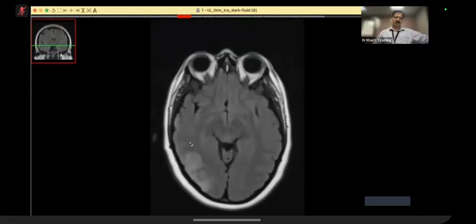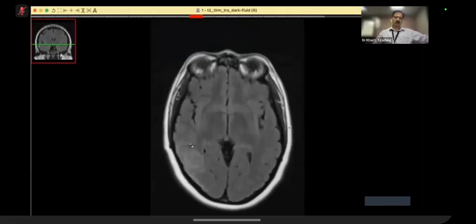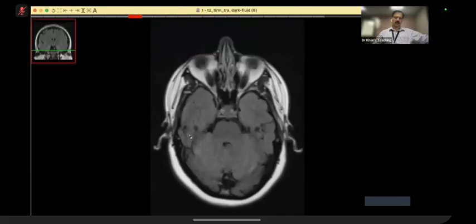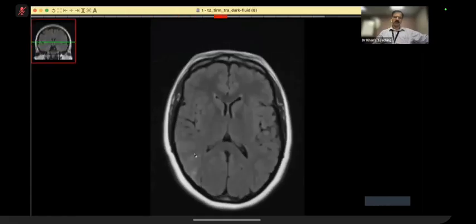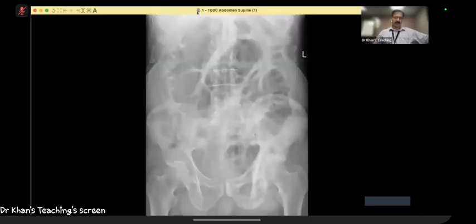And in this case, we did venograms, etc., which I am not showing you right now. The right-sided transverse sinus was hypoplastic. So the hypothesis is that this cortical vein was quite prominent and it was thrombosed, and because of that, there was a venous infarction. So I just wanted to show you that cortical venous infarctions can also be due to sagittal sinus thrombosis or cortical vein thrombosis, and sometimes just because of cortical vein thrombosis, as I have showed you.